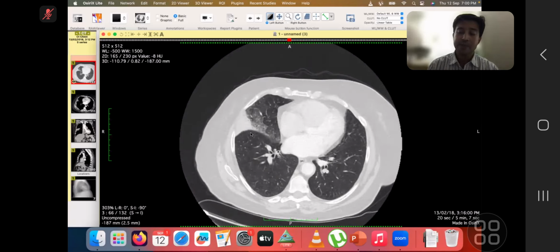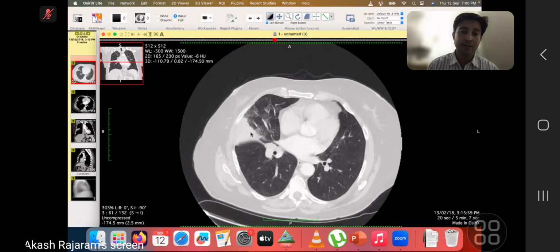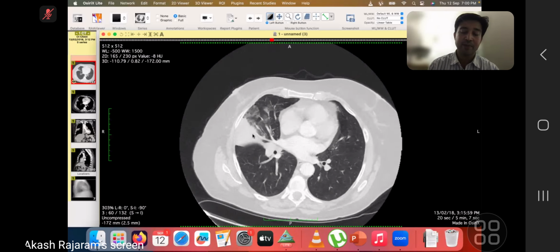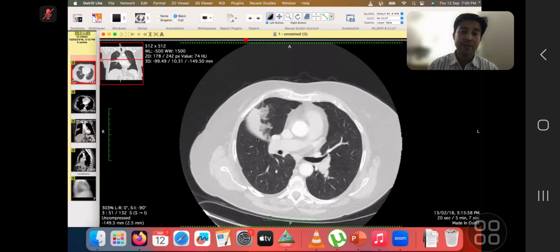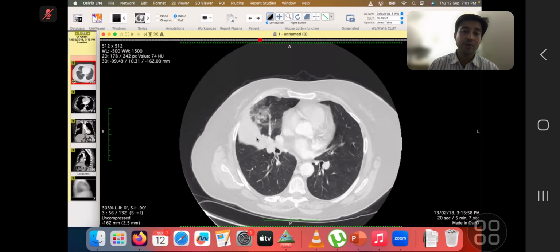You mentioned biopsy. We don't generally do a biopsy in a patient with dry cough. And if you're seeing this picture, you don't do a biopsy initially. Only if it is not resolving after antibiotics on the follow-up CT, you do a biopsy. So that is not correct. But otherwise, this is just consolidation.